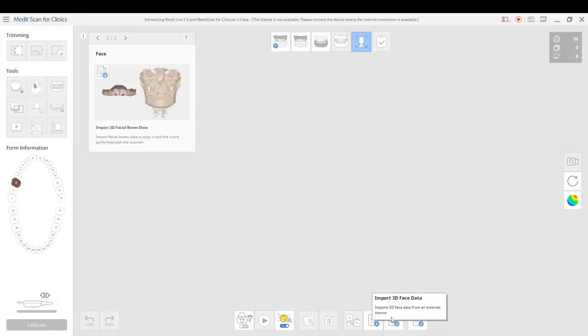We can bring in face scan, we can bring in STLs, not DICOMs, but STLs from a CT scan. And on top of that, we can bring in other models like I demonstrated before. So this is just incredibly advanced features where you can have multiple models for implant cases, where you have gingiva scans, and you've got scan body scan, multi-unit abutment scan, you've got pre-ops, you've got bite, you've got quite a few different layers of information that you can just keep building on, including adding the patient's face scan. So very, very advanced functionality and of great use.